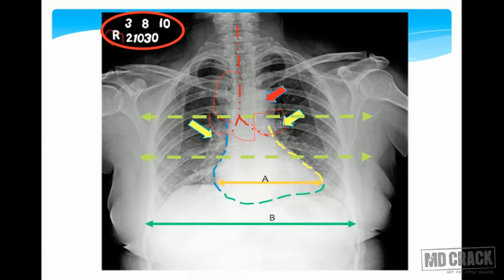or it might be due to pericardial effusion. And these 2 little areas that I've shown over here are basically your costophrenic angles or costophrenic recesses. You have to look whether there's any blunting or not, because blunting over here would indicate pleural effusion or pleural thickening, or maybe even a small neoplasm might do that, but most commonly it is an indicator of pleural effusion or pleural thickening.